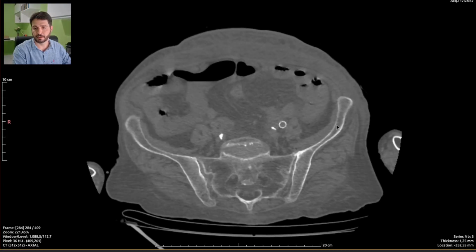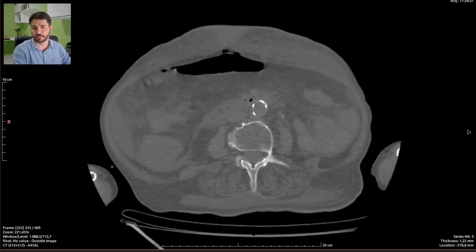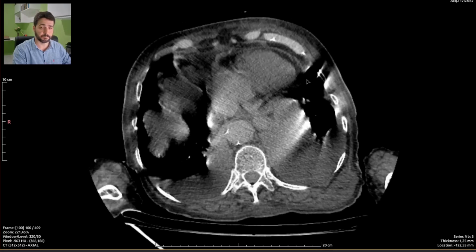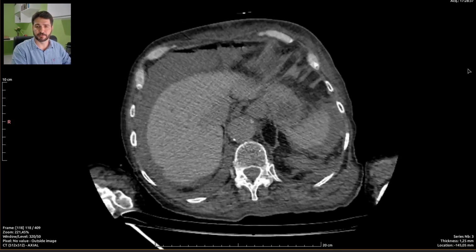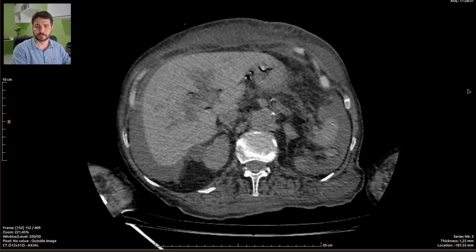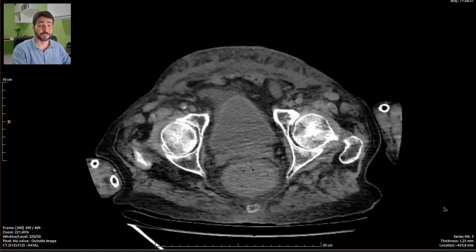Oh, and the patient also has a surprise. She has a stent on the left external iliac artery. So, this is a major case. I'm going to report it so we can get to another less difficult case.